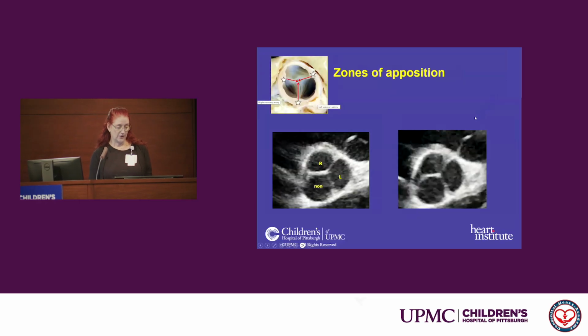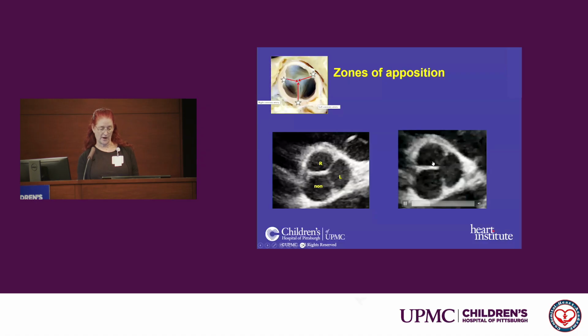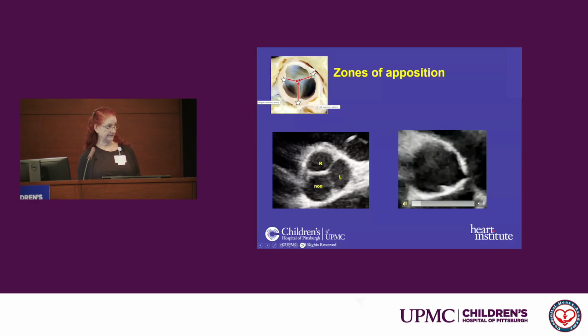Looking at the trileaflet aortic valve, looking at the individual leaflets, this is an anatomical presentation, and this is the echo presentation, anterior, posterior, right, left. This is a short axis view, and here is your pulmonary valve, and you can see how the commissures line up between the aortic and pulmonary valve. In echo we call this the rightward, leftward, and then the non, which faces the atrial septum. As we watch it play, you see a trileaflet aortic valve. Leaflets move well, no evidence of abnormal thickening.